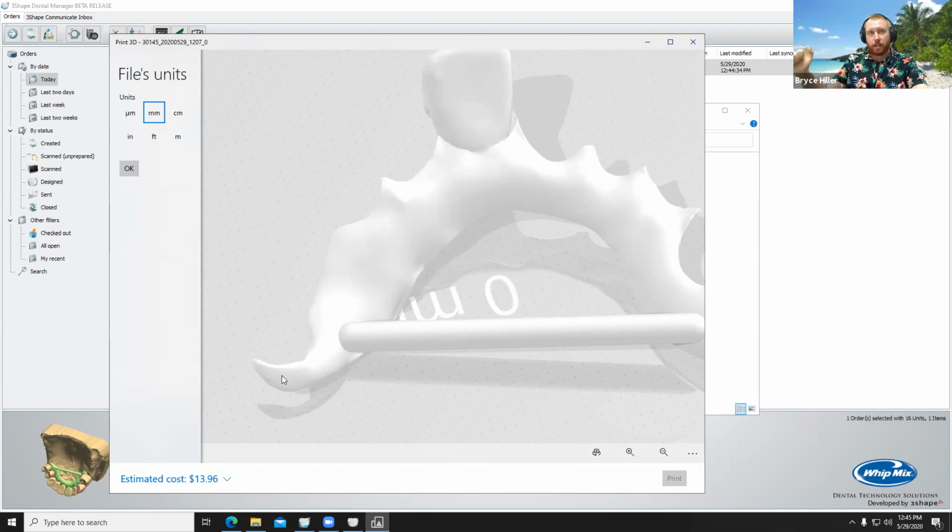maybe use a UV hand light to cure it, add a little bit more, cure it a little bit, just because if you add a big glob of it, there's a good chance it's not going to cure all the way through. So do a little bit at a time, and do that before your final cure. I would add the clasp and backfill it before your final cure.